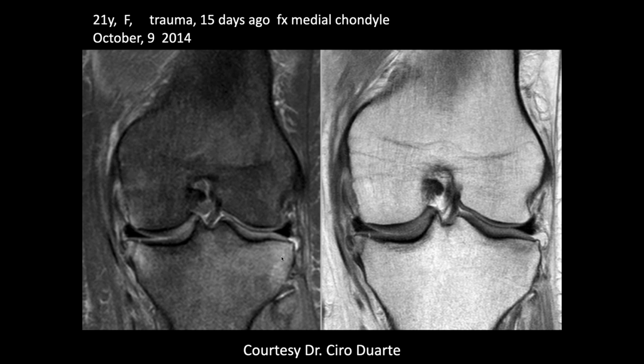Why would you expect more? To get an avulsion fracture over here, right there, it takes quite a bit of trauma. Yeah. I would expect more injury to the lateral side from the impact.